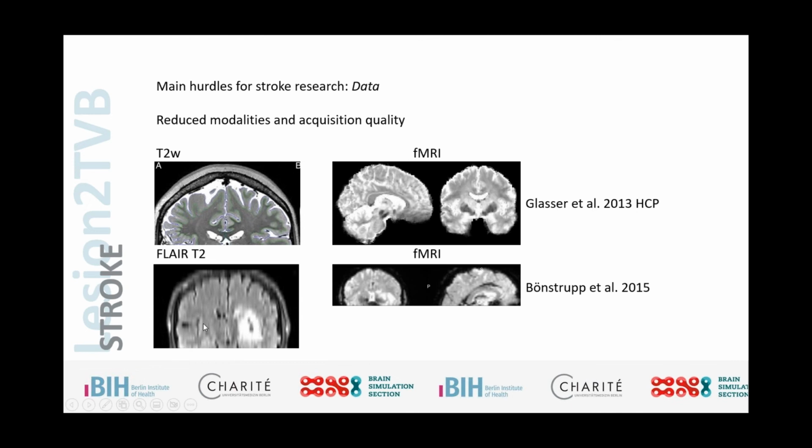When we now look at the FLAIR T2 image that we have in our data, we see already a significant decrease in resolution, and therefore in the quality and the information that is contained in this data. We've seen this before in the T2 image. In the axial resolution, we have a high resolution, and this can really be used for the radiologist to segment the lesion. But if we're talking about the sagittal and coronal axes of the scan, we're talking about maybe, in our case, between 15 and 30 slices, usually. So you have very low resolution as compared to the T2 image, where we're talking about, I think it's 218 slices actually, even along the axial resolution. So we see a lot of difference here.